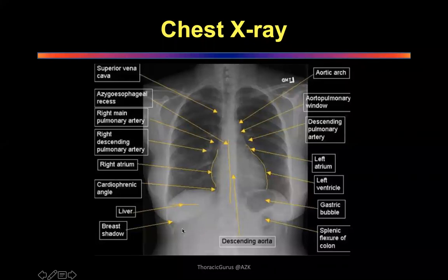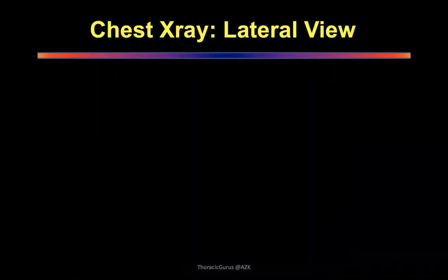So this is how you must actually analyze the whole chest X-ray. The moment a chest X-ray comes to you, all these structures must immediately come into your mind. You must think of all these structures, and you will then get very good at picking up pathologies. Of course, nowadays we are all used to CT scans, but really the chest X-ray is a very good tool for giving you a lot of information, particularly an old chest X-ray.